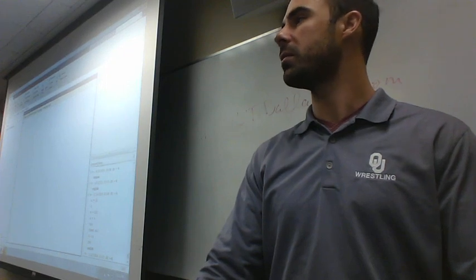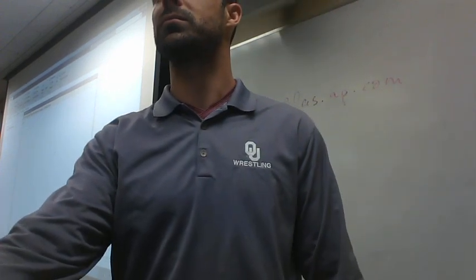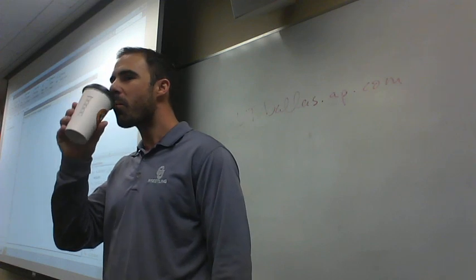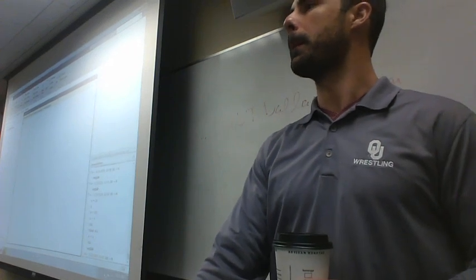Everybody good on that? Has everybody done that? I ended up hitting save, and it popped up with some don't do that box. Yeah. And then I closed it, and it looks like it all opened up. Yeah. Okay, cool. So, what's the next thing we do?